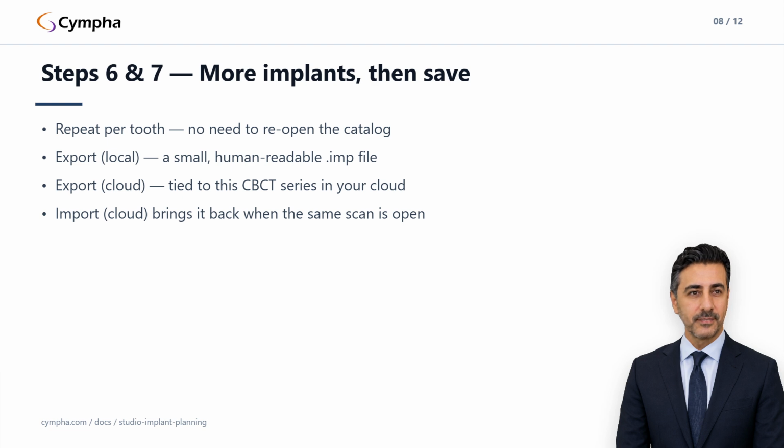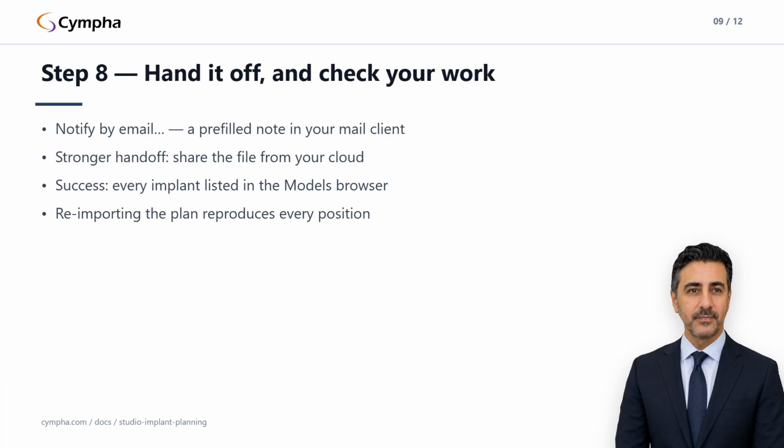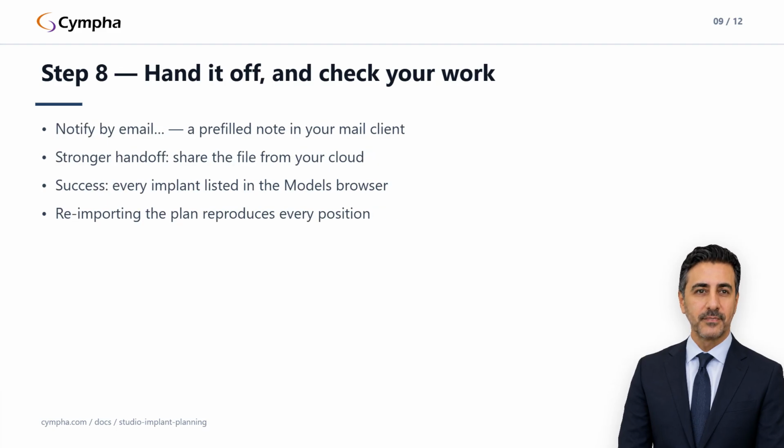And the acid test: the plan file, or the cloud slot, actually holds the plan. Importing it back into a fresh Studio session reproduces every implant at the same position, which is the only proof that really matters. Three things happen after the plan is saved, and it's worth knowing all three before you need them. First, the round trip.